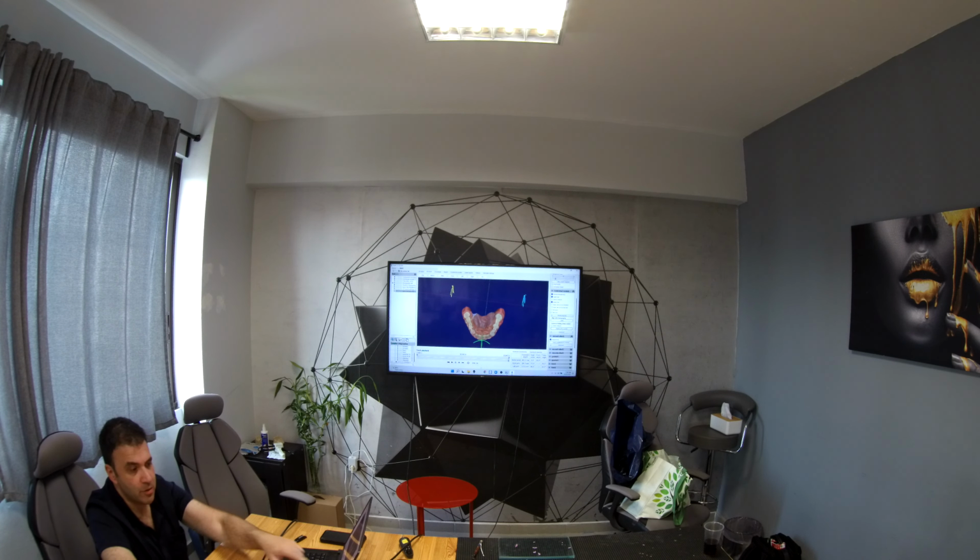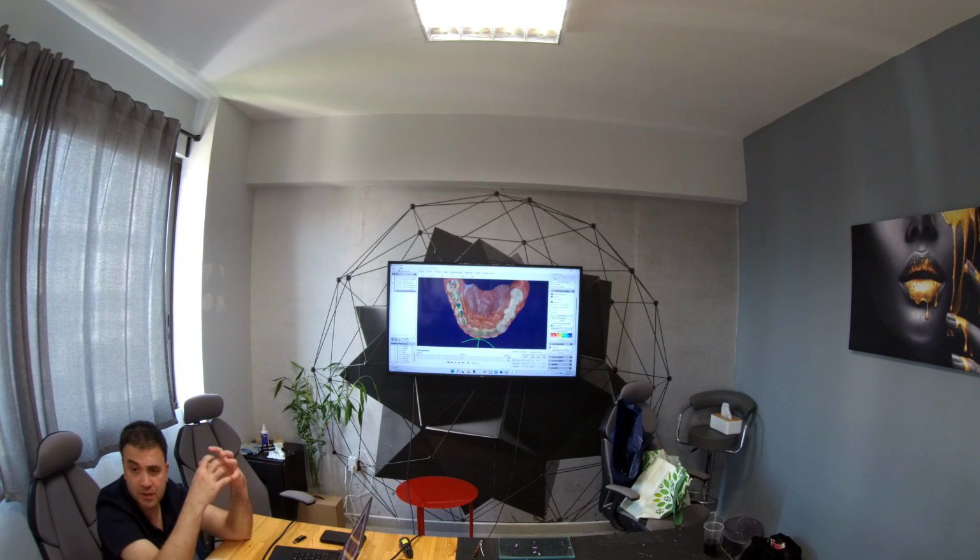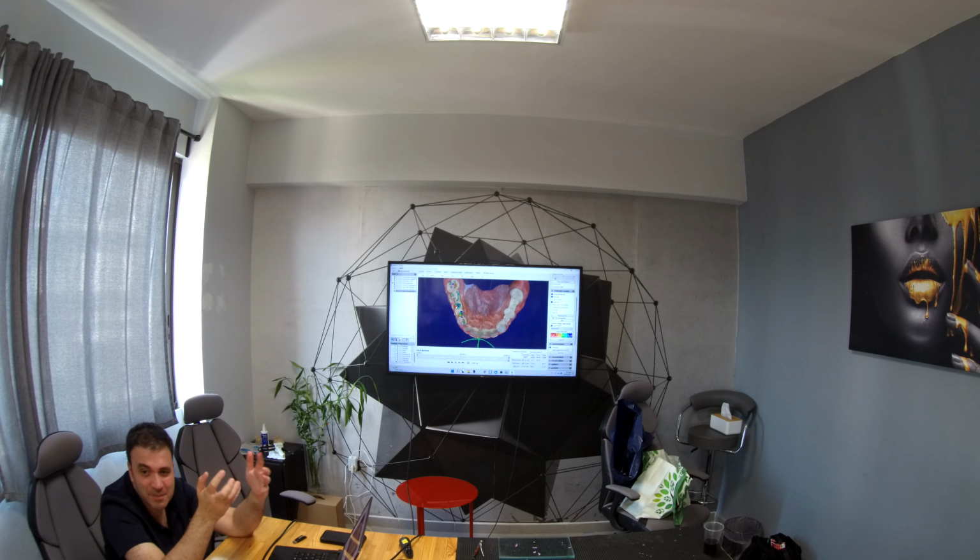So here there is a box, show contacts. I press it. Actually, when you see red, it's not very good if it is bright red. It means that during the scanning there was a problem, the teeth went into each other. It depends on the quality of scanning, usually.